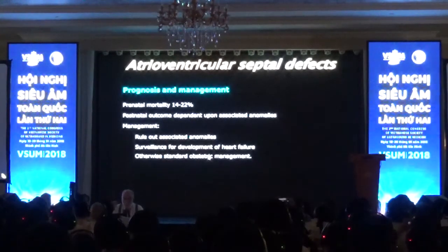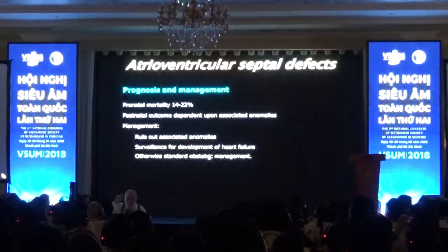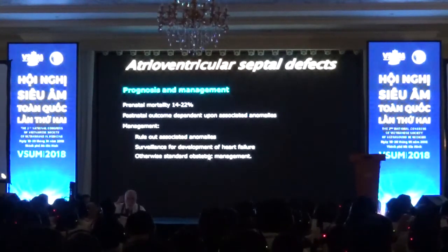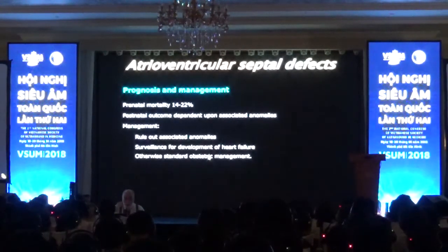So to summarize, atrial septal defect has two big forms. Ostium primum, you're missing the segment between the foramen ovale flap and the crux of the heart. Ostium secundum, you're missing the foramen ovale flap. For the ventricular septal defect, four forms. The inlet, outlet, and membranous are easy to confuse, but they're easy to differentiate from the muscular or trabecular form. Always do color Doppler to see the transfer of the blood during systole and diastole.